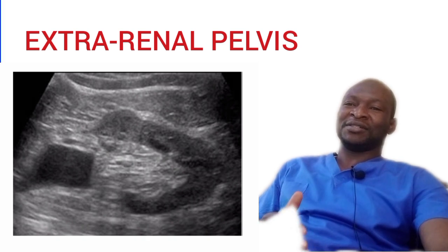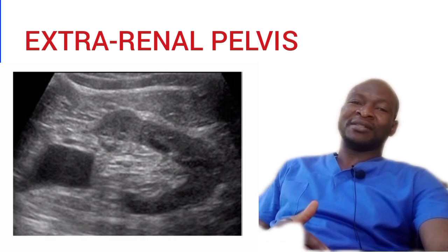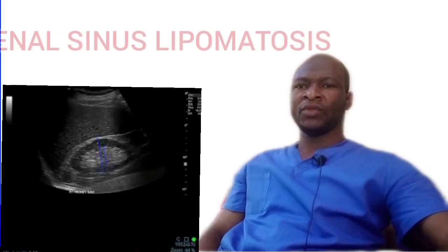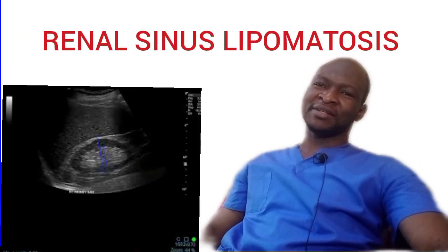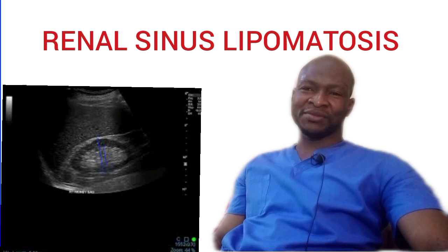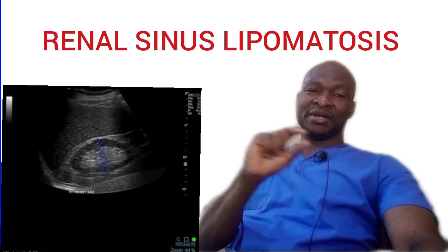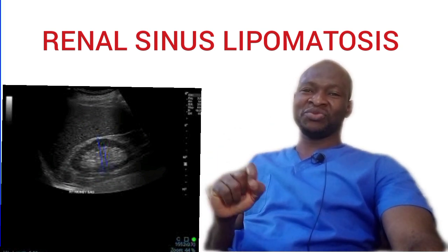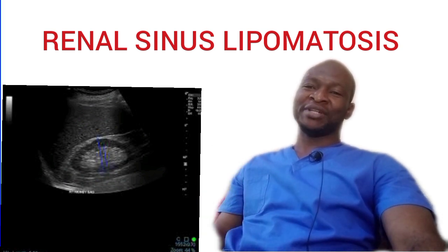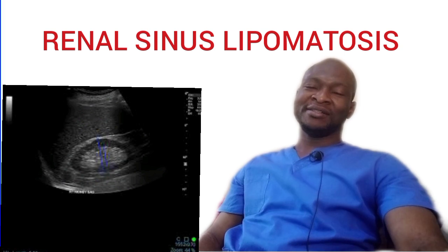Malrotation of the kidney, usually there is an unusual axis of the kidney. It can appear abnormal on a normal IVP, frequently associated with extrarenal pelvis. So have you heard about renal sinus lipomatosis? This is a heavy deposition of fat in the renal sinus. Now, with advancing age, the renal parenchyma thickness decreases, whereas the amount of renal fat increases. Thus, you have the larger, highly echogenic renal sinus that can be seen, and also can be mistaken as sinus neoplasm.